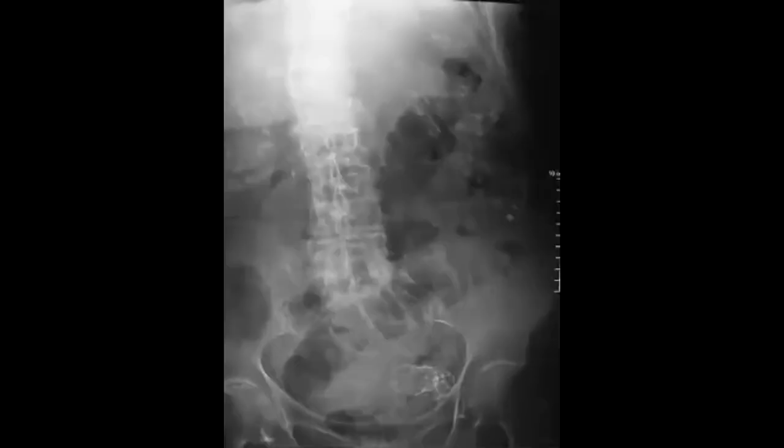So small bowel ischemia is one of the good cases. In the exam, in practice, it can come to you: Doctor, is this venous or arterial ischemia? You know, it means that it's like selected images, so sure that you would like to check. Let's go again, maybe we can see if we can find. For selected images it is a bit difficult.